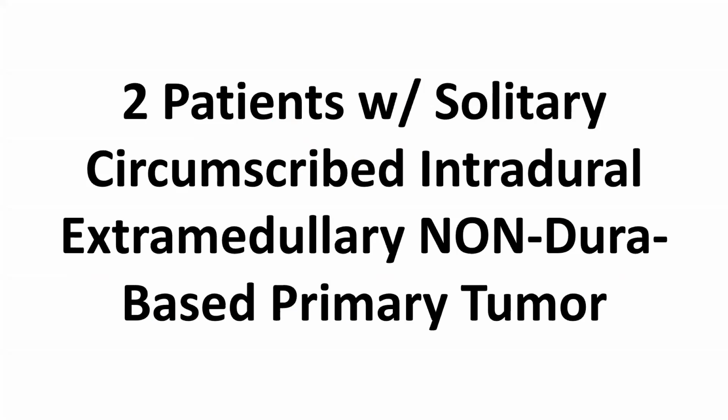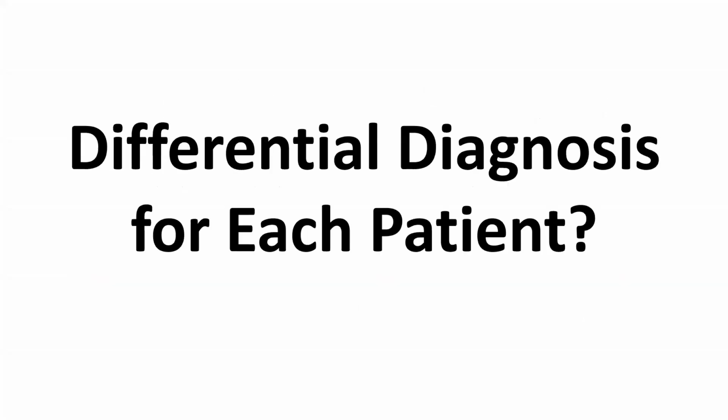Okay, 2 patients with solitary, circumscribed, intradural, extramedullary, non-dura-based primary tumor. All right, 2 patients. I'm going to show you the imaging for the 2 patients, just a snapshot, it's all you need, and I would like to know the differential diagnosis for each patient.